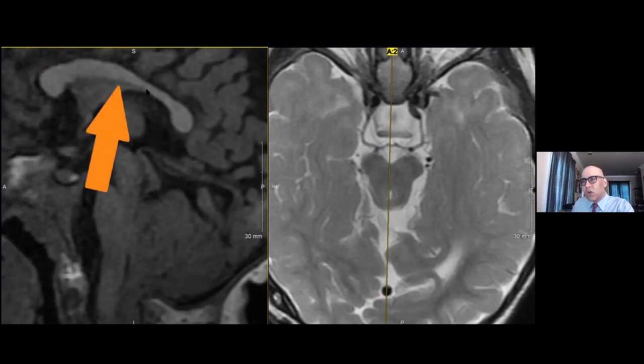This patient, the corpus callosum doesn't look too abnormal. We're seeing somewhat truncation of the rostrum of the corpus callosum, but the genu and the body of the corpus callosum are normal. We have the physiologic thinning of the isthmus, and we have the splenium of the corpus callosum. The corpus callosum may be slightly smaller than usual, but this is not as abnormal as we sometimes see.